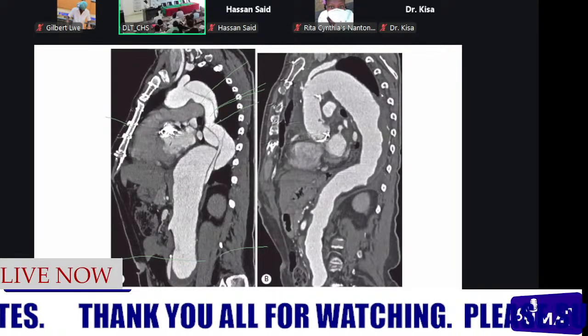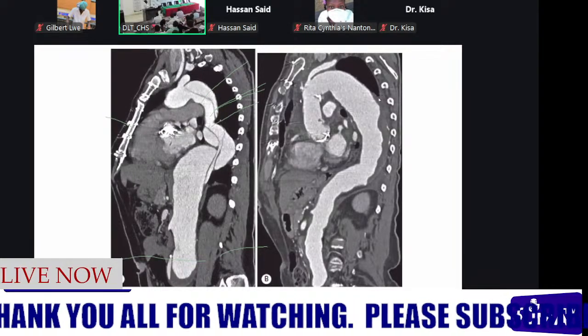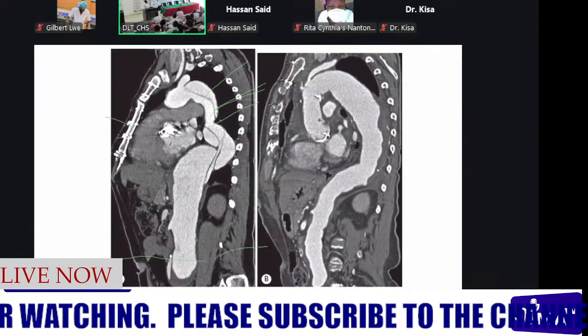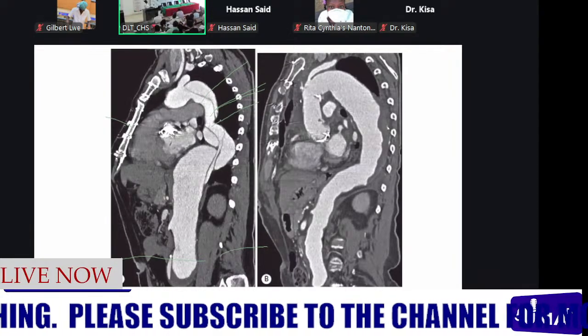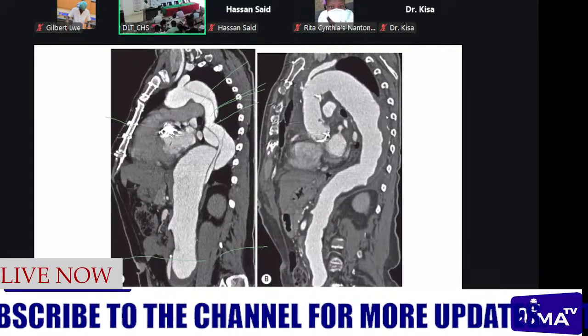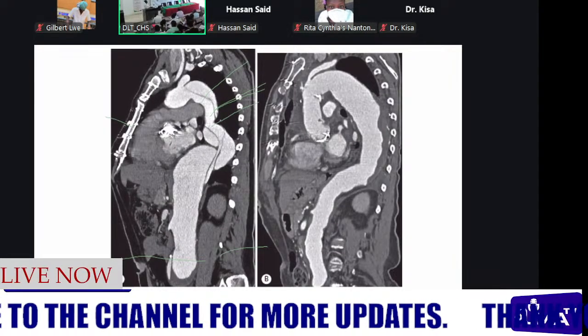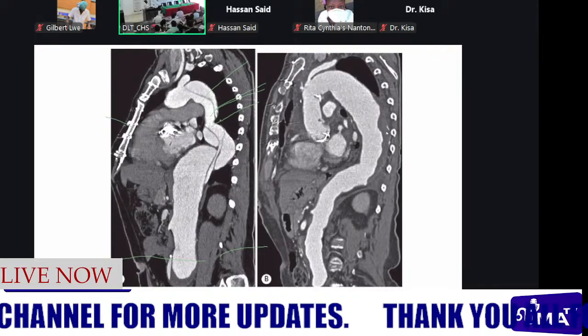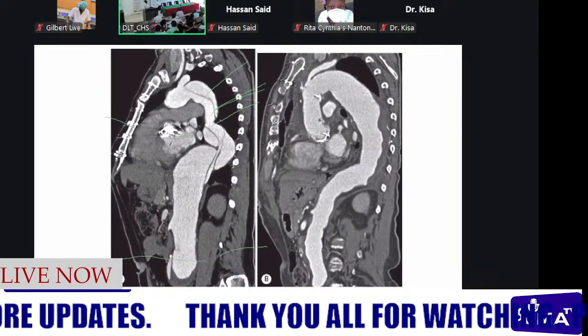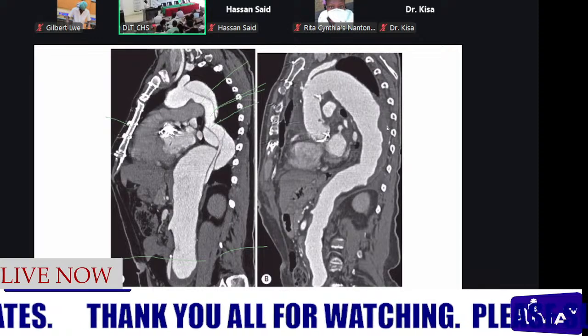Whereas if we have a thrombosed aneurysm, the thrombosis will maintain its position in the posterior wall of the aortic lumen adjacent to the vertebral bodies. And as well here, we can appreciate the aneurysm, then we can also appreciate the externally displaced calcification.